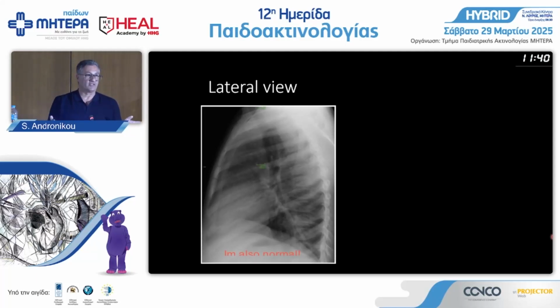Do you do lateral in Greece? For children? Not routinely, okay. So in England, they stopped doing lateral. In South Africa, in America, everybody gets a lateral, okay? So some people don't know how to read a lateral in a child. In England, nobody. You show them this, they go, what's that, okay?